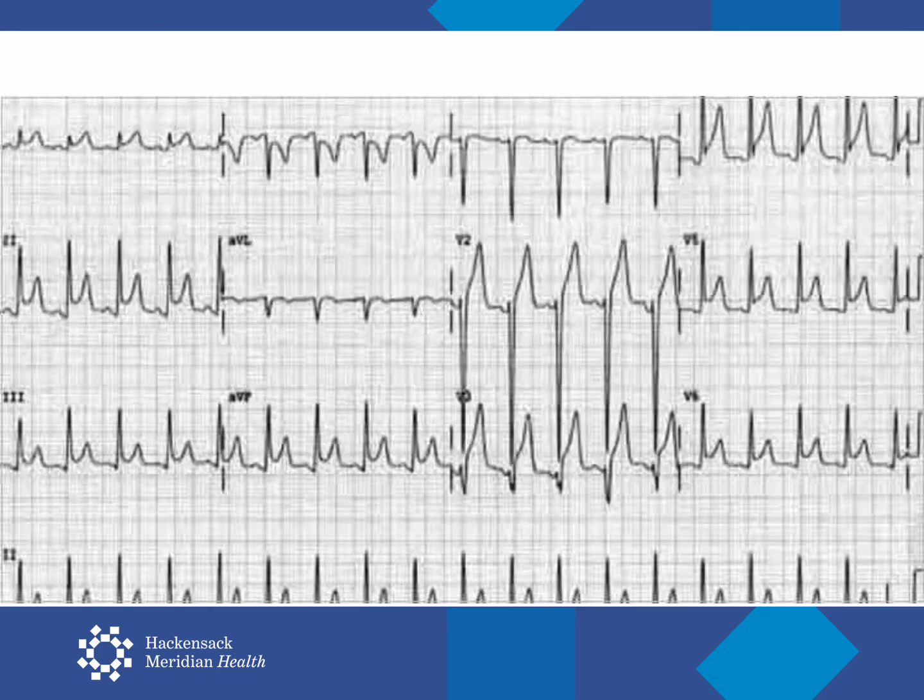This is shown even better in this tracing, which is quite typical for pericarditis. You see ST segment elevation pretty much everywhere, lateral, septal, anterior, inferior. It's hard to imagine a shutdown of all of the coronary arteries at once. Such a diffuse ST segment elevation seen in every lead is very strongly indicative of acute pericarditis. In this case, the PR depression in lead 2 cinches it. Try to remember the pattern. This is acute pericarditis.